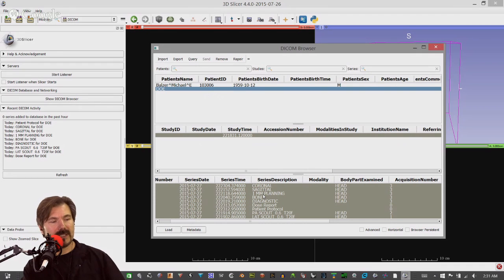You do have to play a little trial and error until you get some experience on which ones actually provide that for you. For instance, I also looked at the bone and the diagnostic, and I found that some had a little more emphasis than others. And what that does is it creates one area that seems very sharp and the other areas are very rough. So try and find the one that has the best balance.